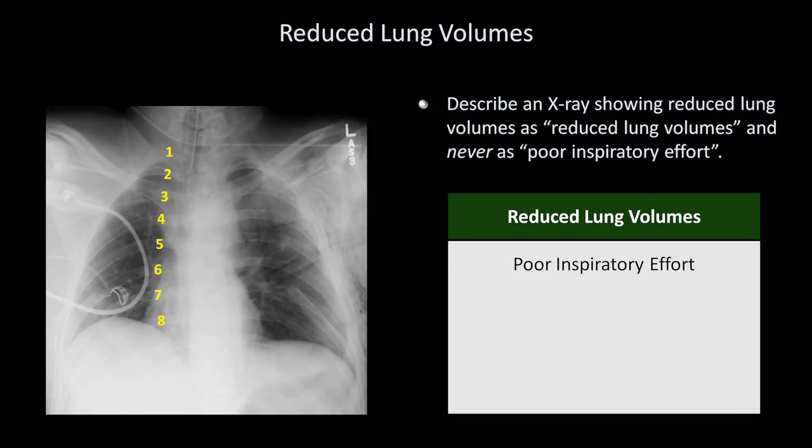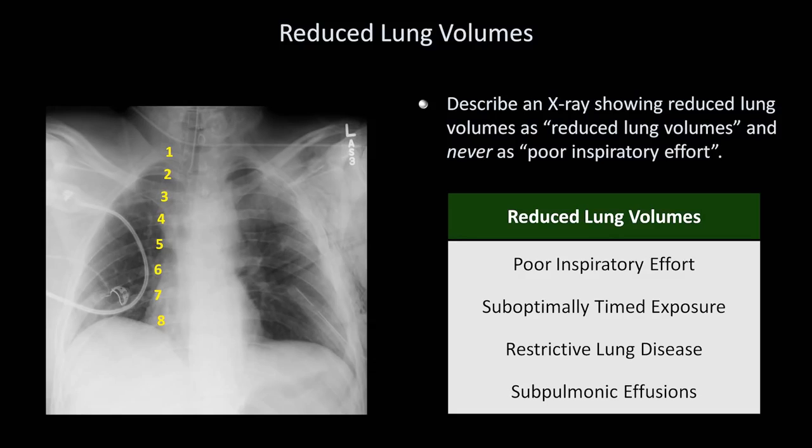It may also be the consequence of a suboptimally timed exposure. It can obviously be seen in restrictive lung disease due to any of the aforementioned general mechanisms. And finally, it can be the consequence of unappreciated subpulmonic effusions, which were discussed in the last video in this series.